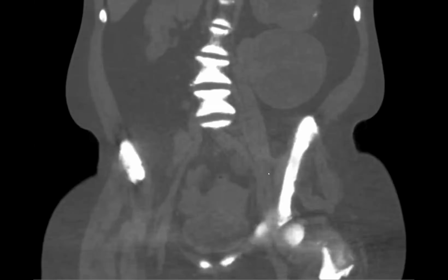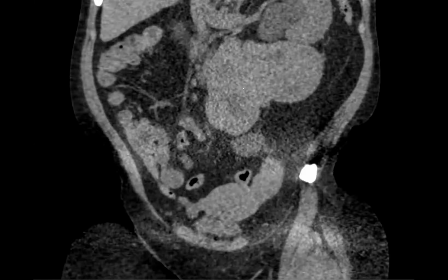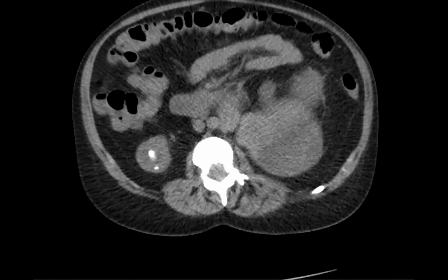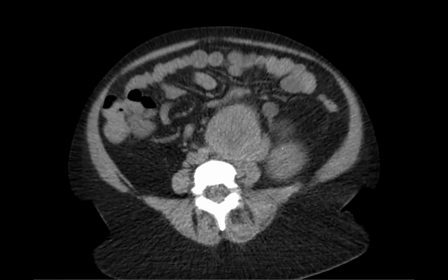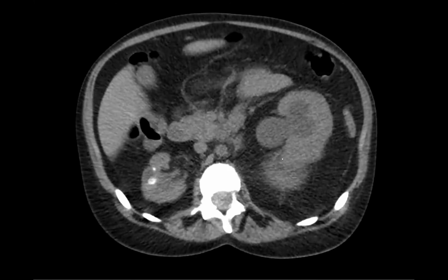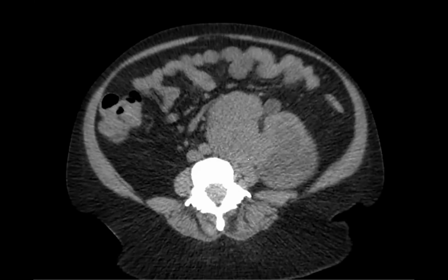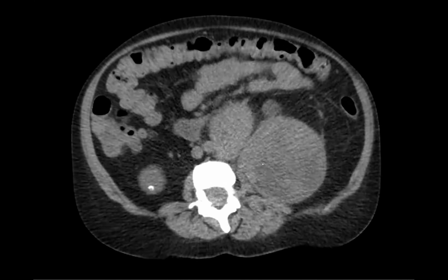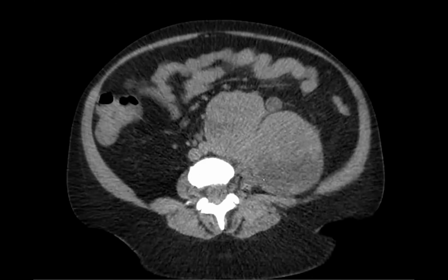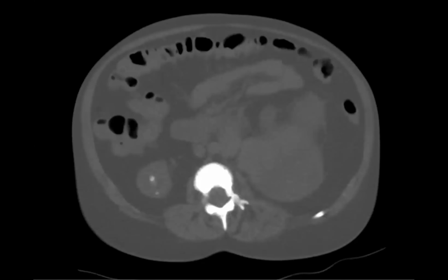Oh, wow. And then this retroperitoneal mass was extramedullary hematopoiesis. Nice. So normally when we think about a retroperitoneal mass, we can just talk about the differential. Common things are going to be liposarcoma. This one didn't have fat in it, although dedifferentiated has less fat. We can think about leiomyosarcomas of maybe the gonadal vein, and solitary fibrous tumors. And then, of course, the mets, like you were saying, is it a male patient? So could this be a huge nodal met from a testicular tumor? But the bones were the key, super dense bones.